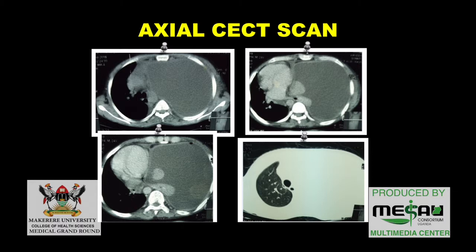The cuts that we got are below T5, so we cannot appreciate the trachea. But this is the esophagus, and this is the heart shadow. It has been deviated, okay, markedly. At least we can all appreciate that.